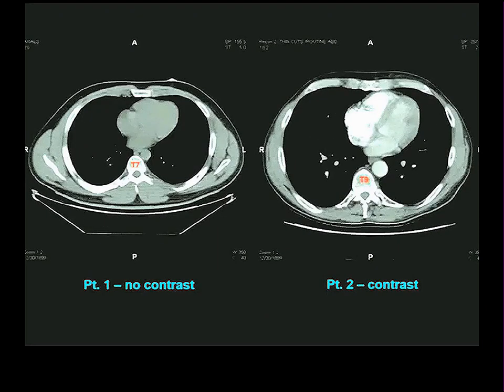Right? Here's a person, here's just the heart with contrast. You can see now the left ventricle, how thick the wall of the left ventricle is, because here's the contrast filling this chamber. You can see the left atrium here, and it's a much thinner wall. This must be the mitral valve right there. Here's right ventricle and right atrium. Their positions haven't changed. And obviously, most of the contrast material is found on the right side of the heart. And maybe this is the tricuspid valve. I don't know. Maybe not. You can see the interventricular septum, because now the chambers are filled with a radio-opaque substance which has a different density.